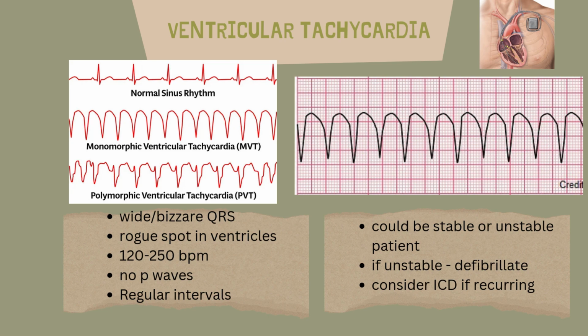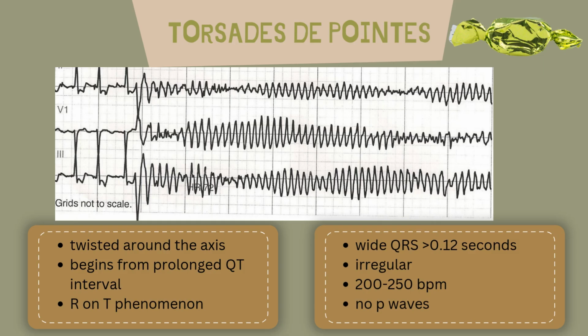Now, let's talk about V-tach and give it a twist. Literally. I know, the jokes continue.